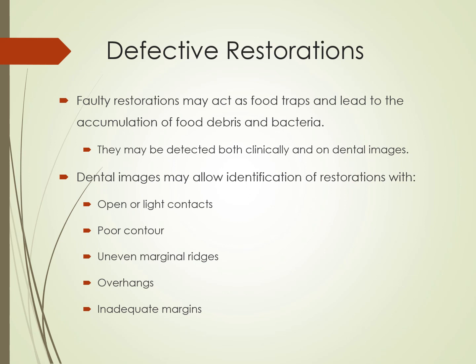So if the margin of the crown doesn't go evenly with the tooth, doesn't smoothly lay down against it, then it will trap food underneath the margin. An overhang, which we've talked about as amalgam overhangs, but you can certainly get an overhang with a composite or any type of material, gold, I guess, will have an overhang.